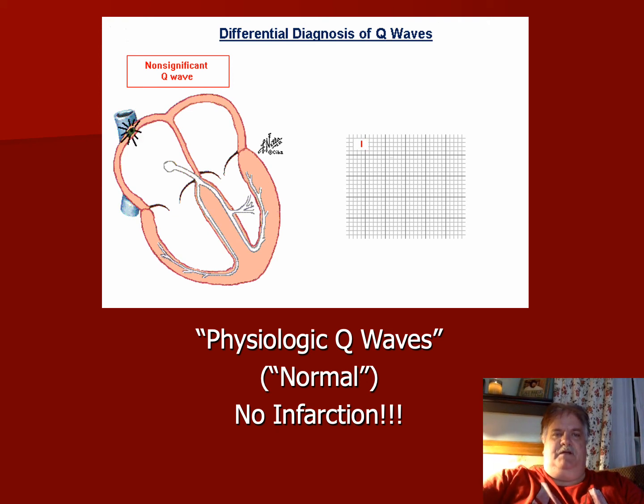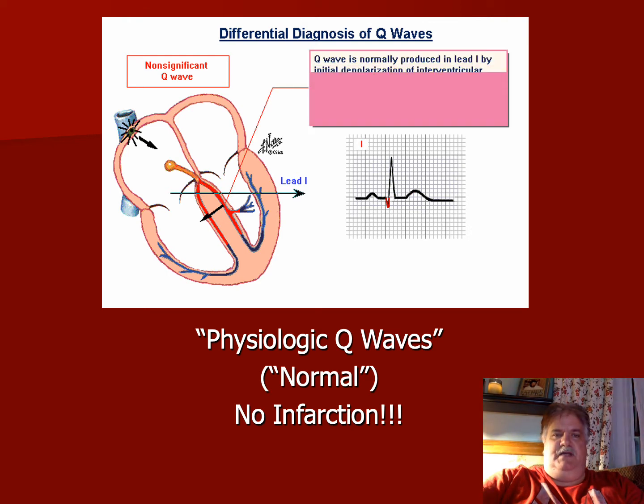Let's talk about the differential diagnosis of Q waves. Two different types. The physiologic or non-significant Q wave, which is normal. There's no dead cells from infarction.